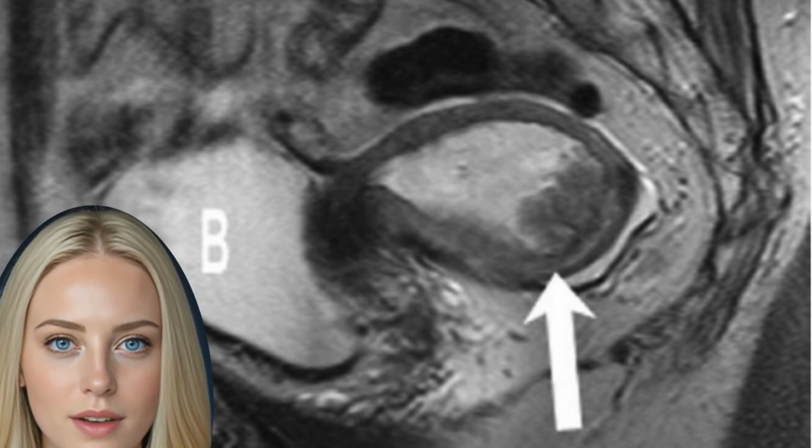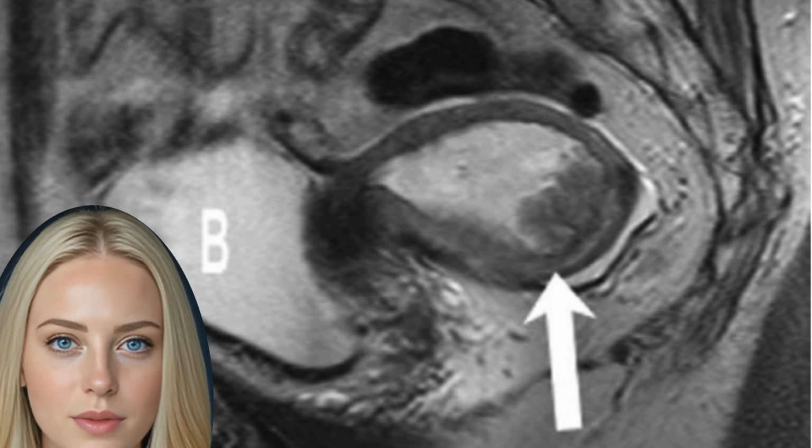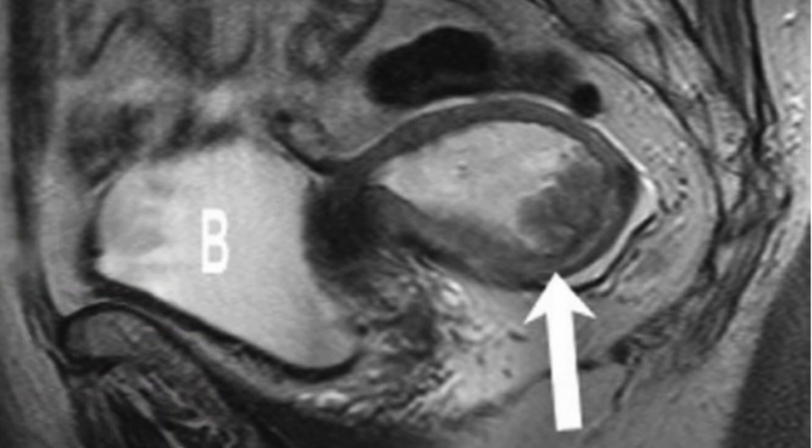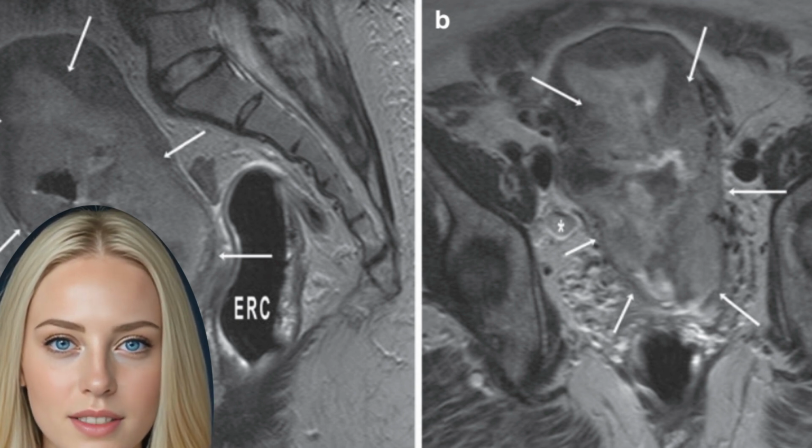Native high-resolution T2 weighted images, T2WI, are essential for morphological differentiation of pelvic organ tissue. Contrast-enhanced T1 weighted images, CT1WI, give important additional information in almost every problem and should therefore be routinely performed. However, kidney function, creatinine, should be checked before the intravenous application of contrast media.